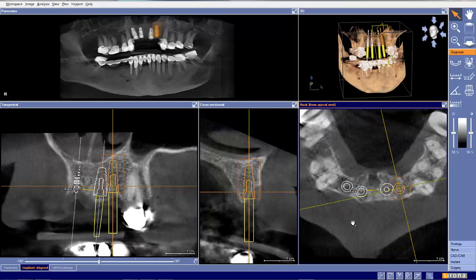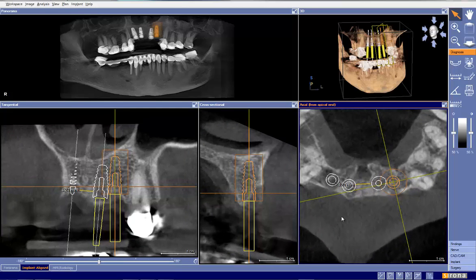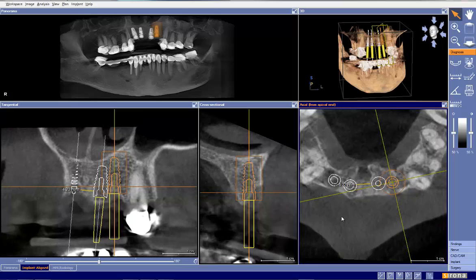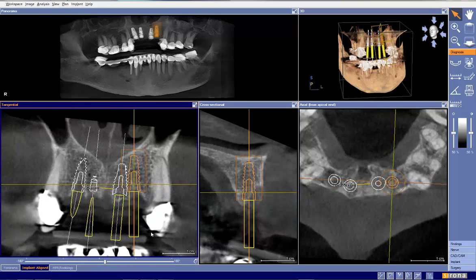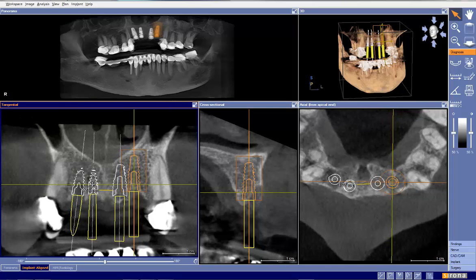So hopefully this helps. There's a lot going on here. It's, again, without tooth data, very difficult to determine the exact positioning, but my takeaway on this particular case would be that in order to place these implants to replace 7, 8, 9, 10, we would have to do some type of implant bridge, because it'll be very difficult to get the spacing that we need in this little site.